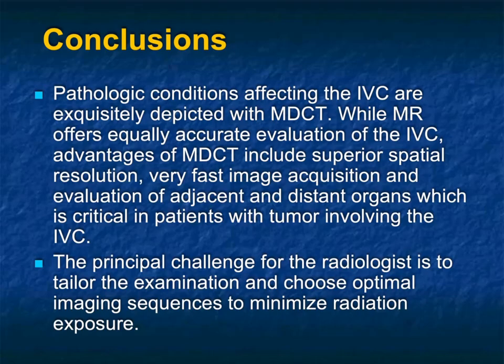Think about the different pathologies with IVC involvement, from tumors to inflammatory disease. Some of the secondary signs in the IVC, whether it's a flat IVC suggesting hypotension. Think about the cases where IVC has been treated, like with a stent, looking for complications. When you think of all of that, I think you'll do a great job.